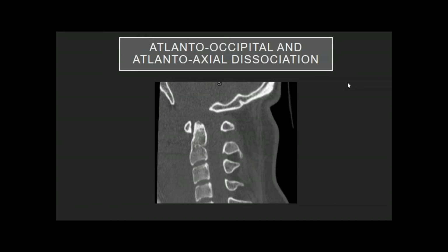So this patient has been, oh, I can't hear you guys. I wish I could, but I can't figure out how to hear you guys through this thing. Sorry, I just looked at the chat and saw your questions. Okay, but you can see there's this really, really large space between the skull base and the dens. So this patient essentially has gotten decapitated. If you guys have any questions, please just go ahead and type it in the chat, because I'm not sure if I'm going to be able to hear you guys through this. All right.